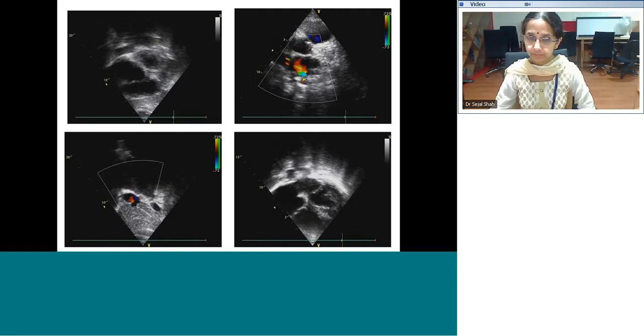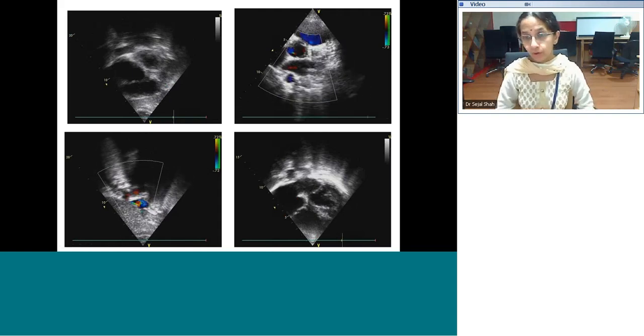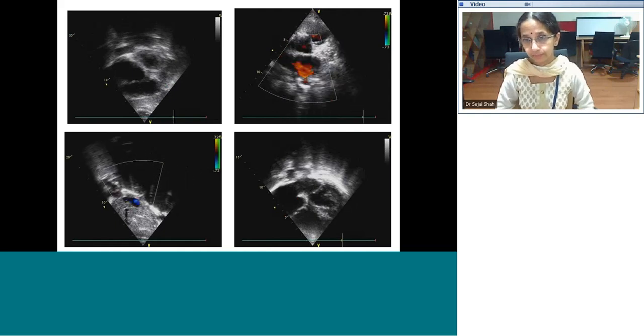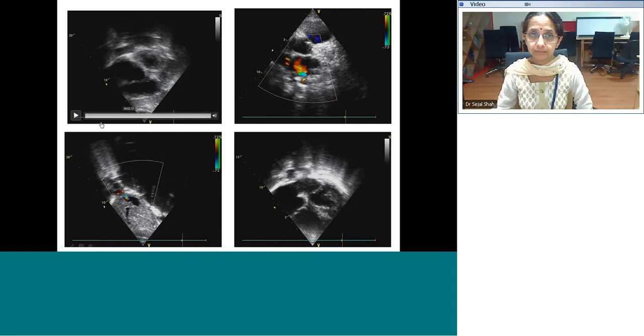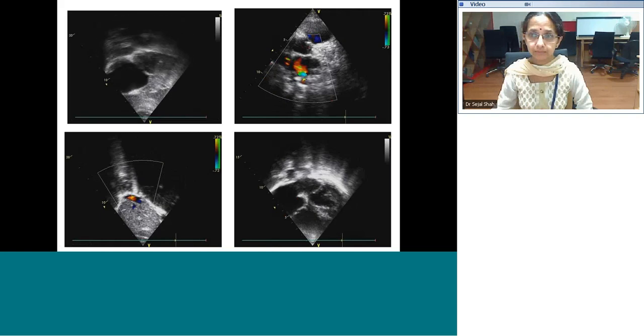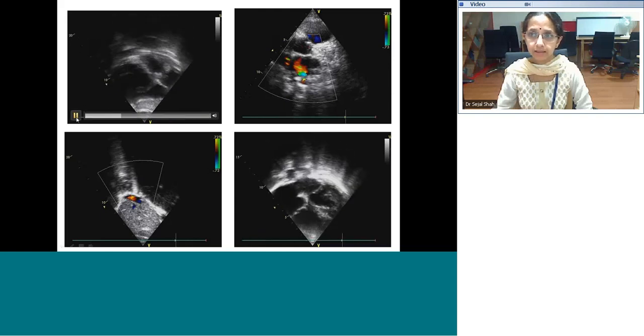Yes, correct. So the right heart is dilated, and now you will run through your thoughts where all the right heart becomes dilated. ASD, TAPVC, yes. So is there an ASD? That's why this subcostal is kept. Do you think there's an ASD? So you think it's a TAPVC?